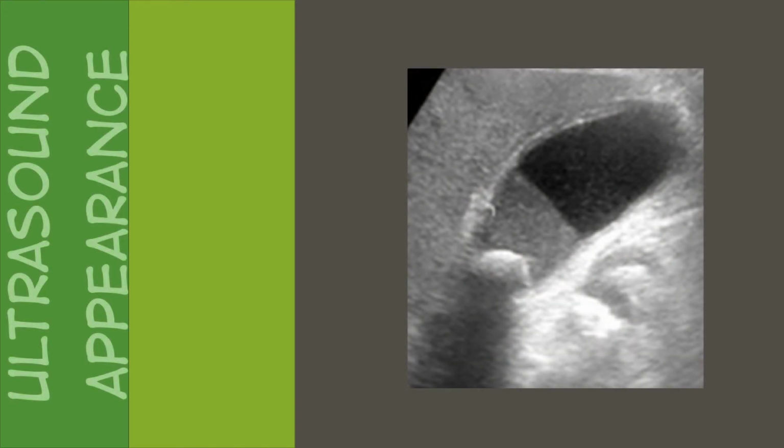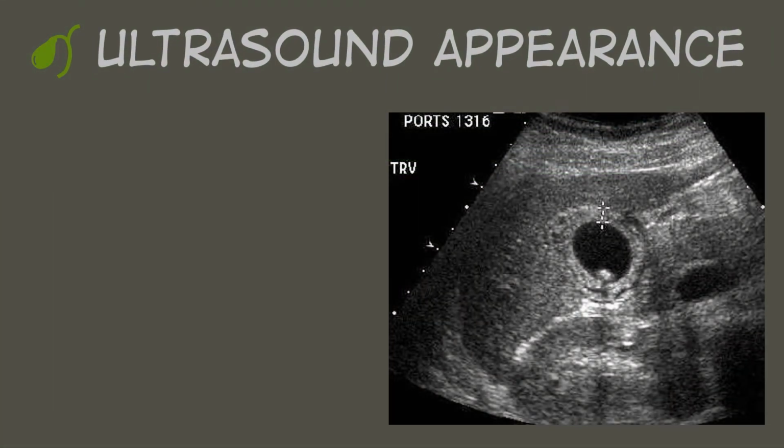Because acute cholecystitis is not only basically a surgical emergency, but it's also a super common finding on ultrasound, especially from emergency room patients. And so we want to make sure that we are able to diagnose acute cholecystitis with our pictures and get all the right information to the radiologist so they can make that call. Acute cholecystitis has very specific things that we are going to be seeing.